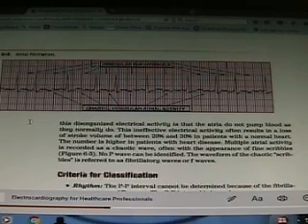And look at the R to R intervals. If the P wave isn't working right, remember, it's right on top of and right next to the ventricles. Do you think the ventricles are going to be able to fill up correctly? No, so it's going to struggle.